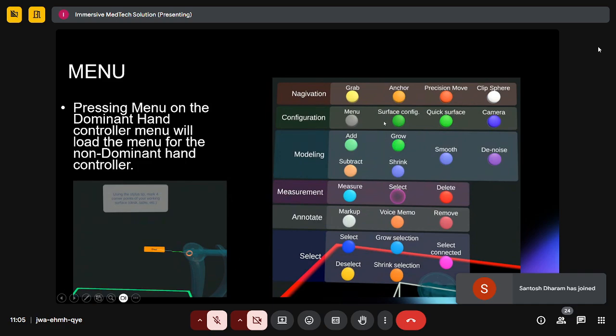Similarly, let me have a quick recap. We have used the region growing in a simple way, where we used to grow the region on the basis of a threshold value. Whenever we have assigned a threshold value, according to it, whenever we press on a certain region, it used to grow that particular region, as was shown in yesterday's session for the blood vessel segmentation. The opposite of this growing is the shrink. To shrink the size, if we have included some noise in the existing structure, we need to remove the noise. We can use the shrinking operation.